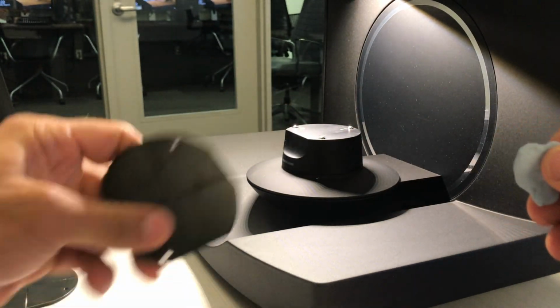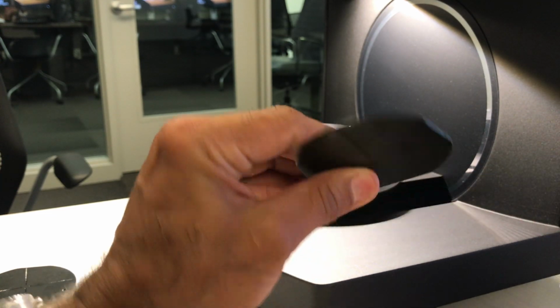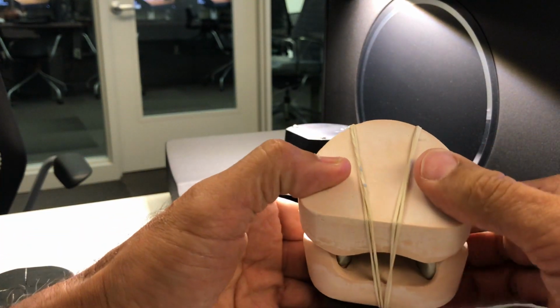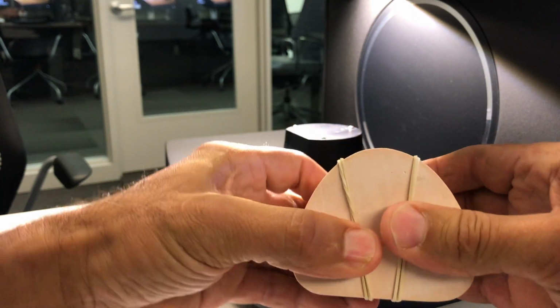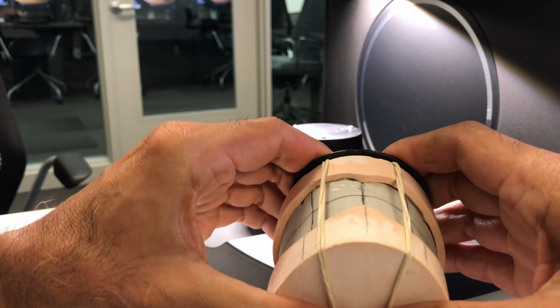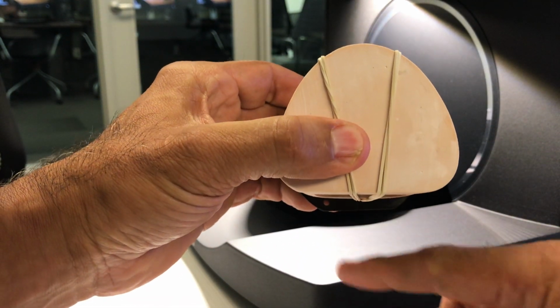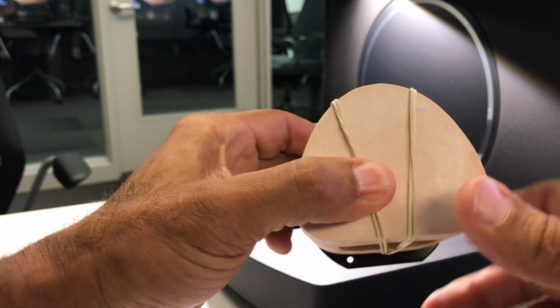Take a little bit of putty material, make sure that the little concavities that we talked about face down. And once again, I want to center my models over the plate, and as I do so, I'm firmly pressing the models against the plate so we get a little bit of tackiness for the material. And again, the back of the models are parallel to the flat portion of the plate.